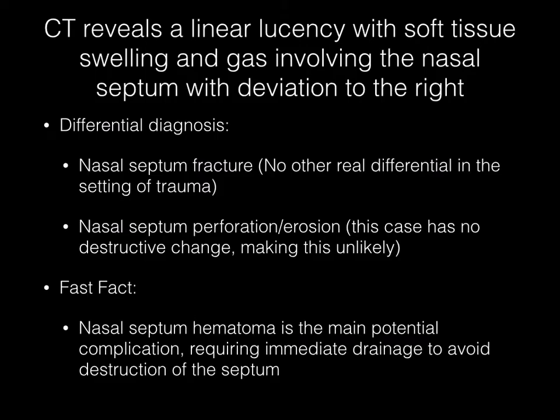Non-contrast axial and coronal CT images through the facial region reveal a linear lucency with soft tissue swelling and gas involving the nasal septum, with deviation of the septum to the right. Differential diagnosis should include nasal septum fracture, and in the setting of trauma, there is no real differential here. Otherwise, nasal septum perforation or erosion could be mentioned, although this case has no destructive change, making this diagnosis unlikely.